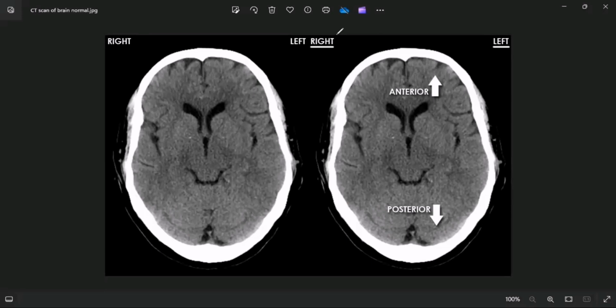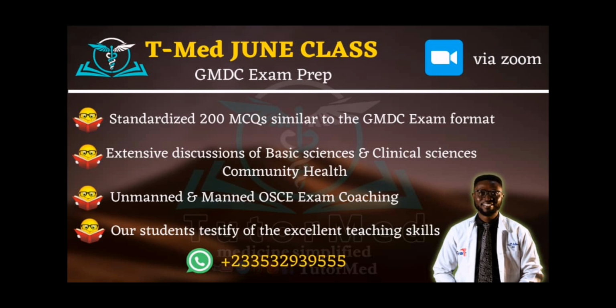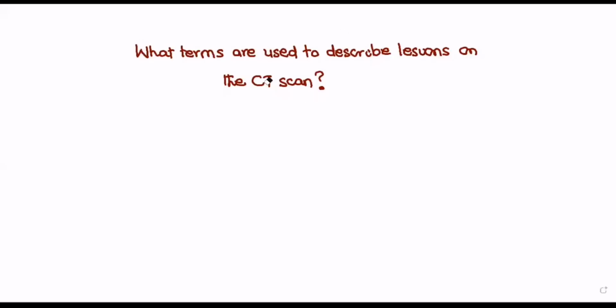Now, listen. Like I was saying, when you are describing radiological investigations, you use some terms to describe them, whether hyper, hypo, or iso. If you are a lesion and you have the same density as the brain, you are described as isodense. So: hyperdense, isodense, hypodense.